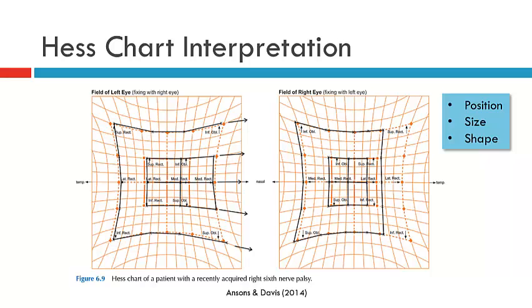Now, we don't have constriction of fields, we don't have limitations in opposing directions, we have what seems to be consistent with a muscle sequelae, and therefore what we have here is likely to be neurogenic rather than mechanical.